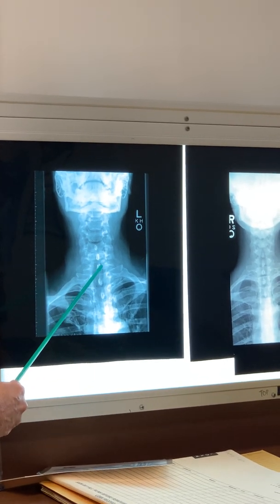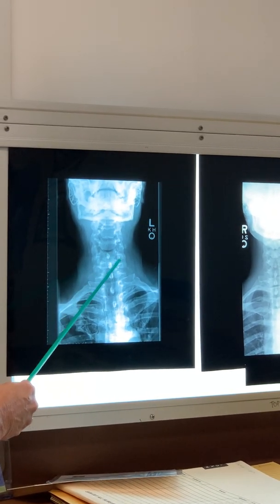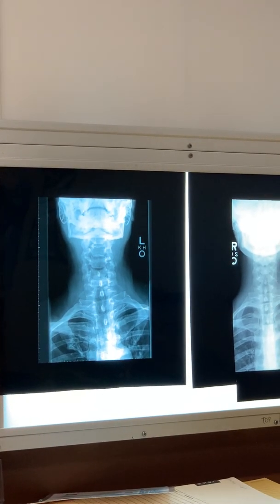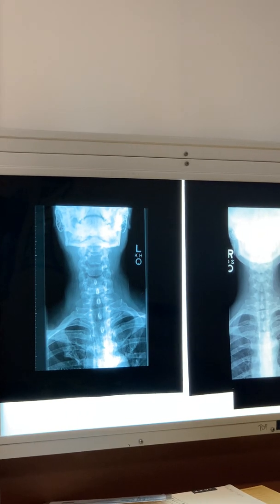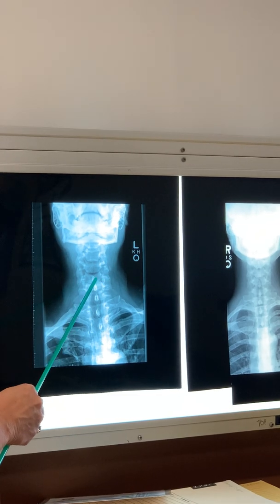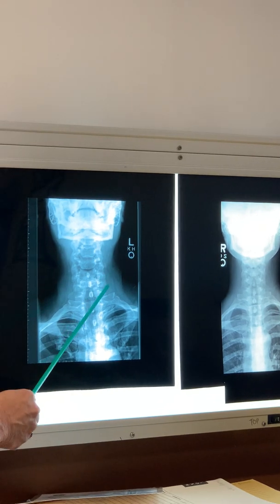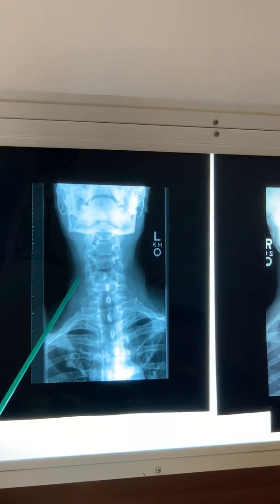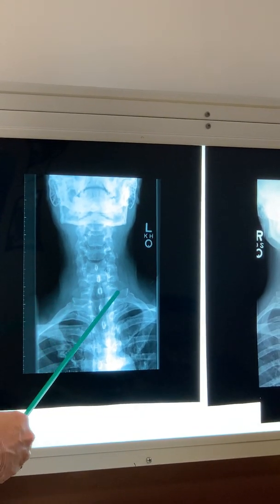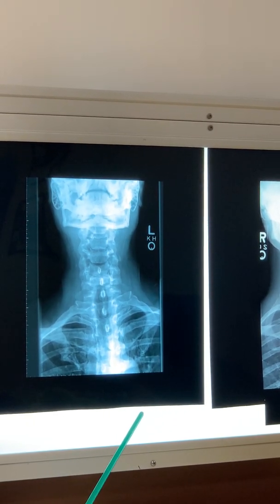All right. So what are these? The line. Spinous processes, and if there was no rotation, what do you look for? Equidistant. Yeah, they're equidistant. A lot of times you can see pedicles. We don't really see open intervertebral disc space. I don't know, maybe this is an older person. I don't know if they did an angle or what, but they're not very open.